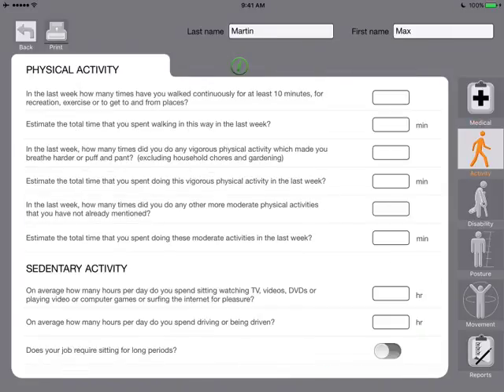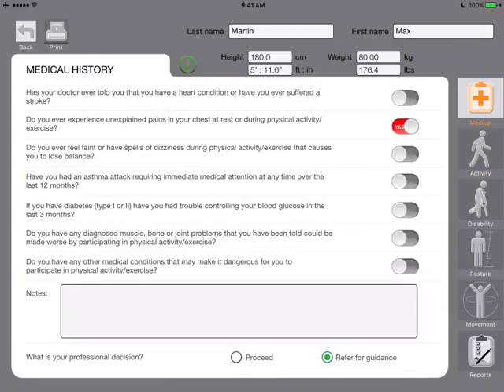This one's blank at the moment, but we know that someone who is less physically active, more sedentary, is more likely to get injured once they commence an exercise program. Going back to the BMI, we know that someone with a greater BMI, assuming that it is coming from excess adiposity, is also more likely to get injured as they start a physical activity program.